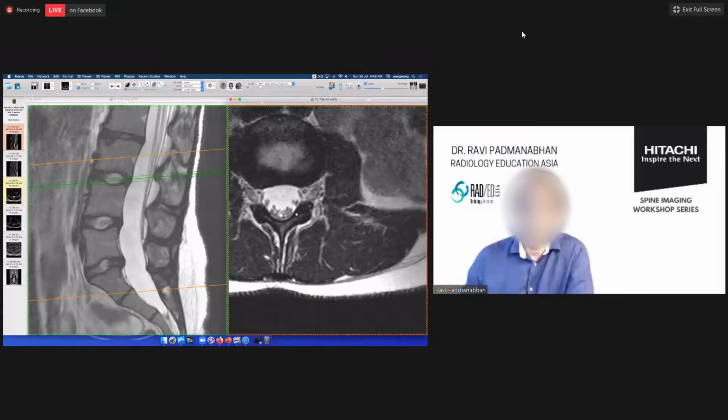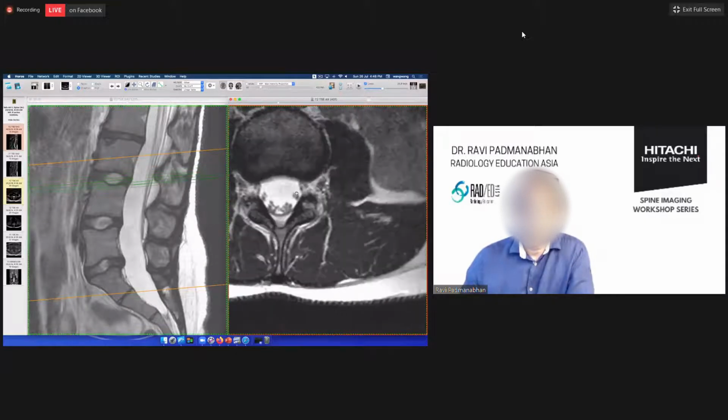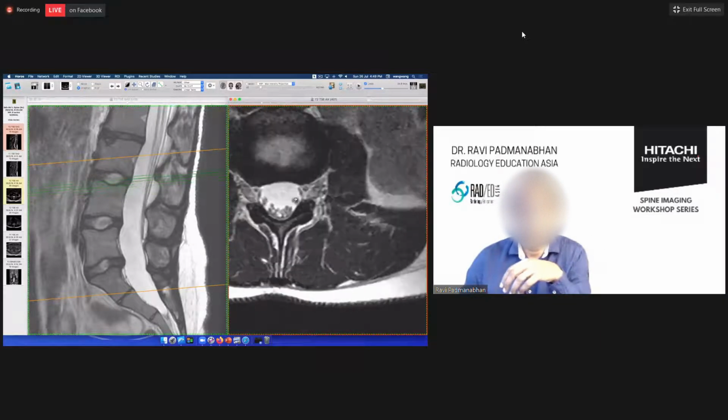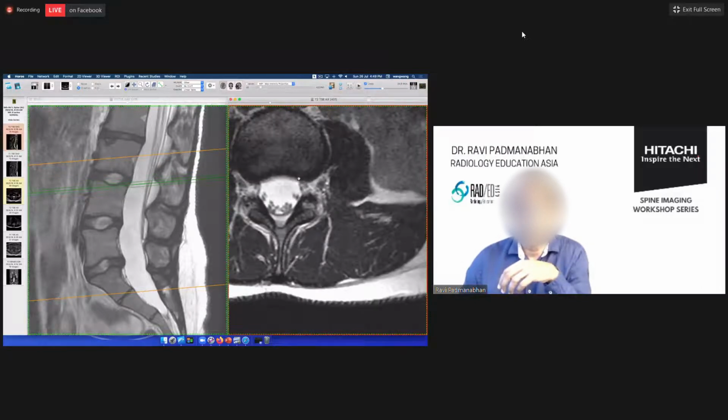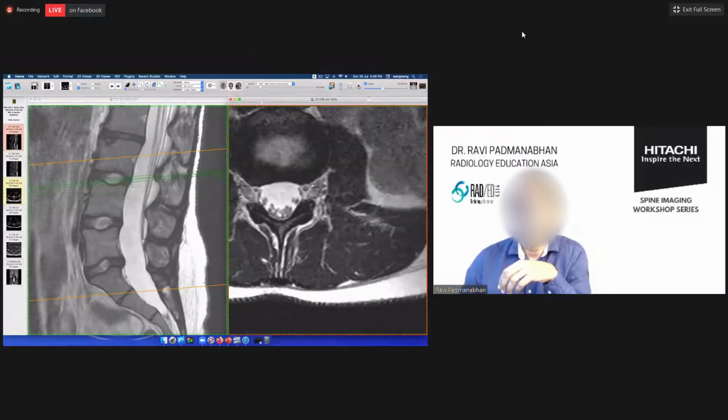So this will be, sorry, let's go down here. So this will be the L4 nerve root. This will be the L5 nerve root. So they go out sequentially. So if we're at this L3-4 level, the first nerve root that's there in the canal is going to be the L4 nerve root. The nerve root that comes out is the L3 nerve root.